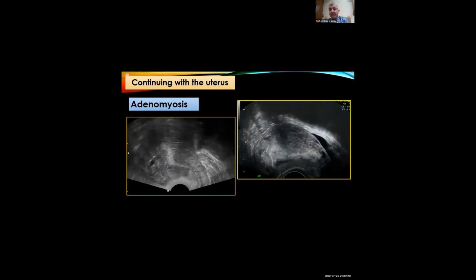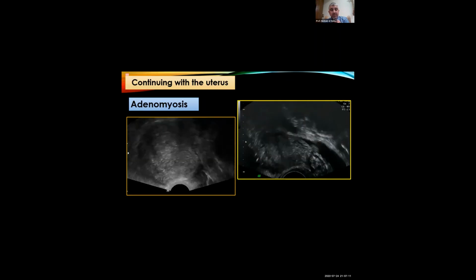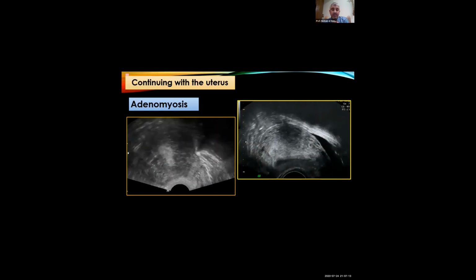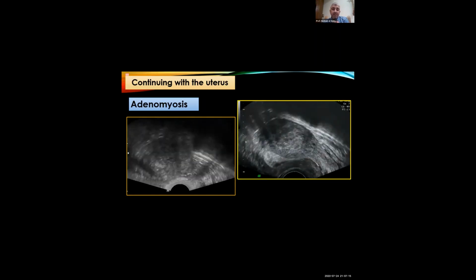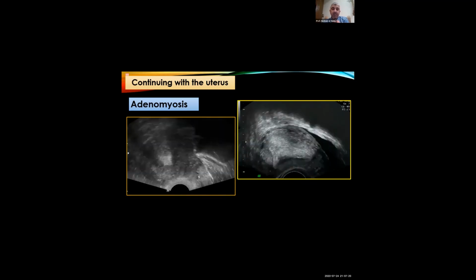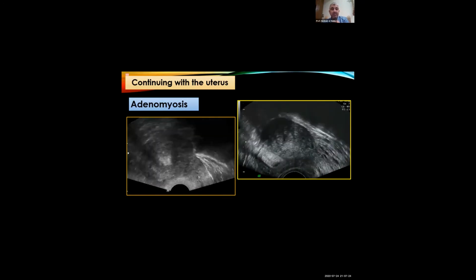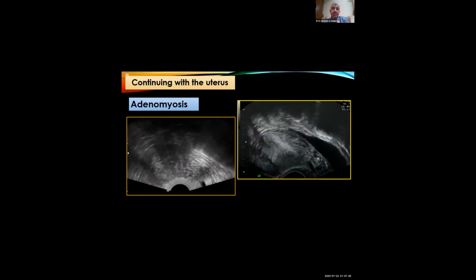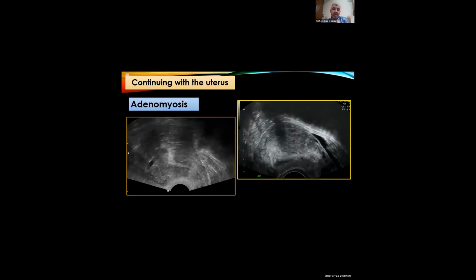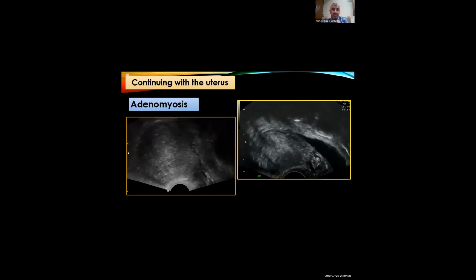Moving on with adenomyosis that affects the uterus. We all know how adenomyosis looks now. There have been a lot of studies explaining the different signs and the power of each sign in order to diagnose: asymmetrical enlargement with heterogeneous myometrium, subendometrial non-vascular cysts, sun ray appearance. All this indicates that what you are seeing is an adenomyosis.